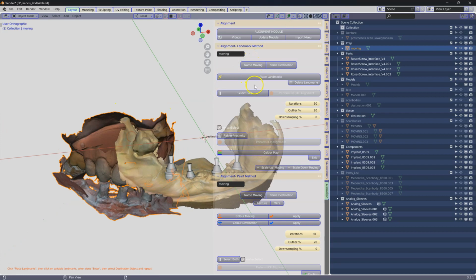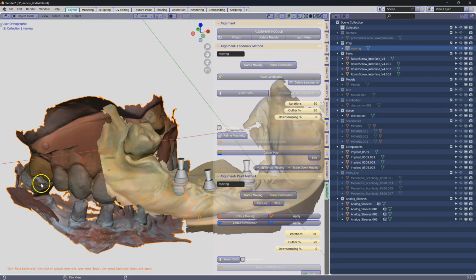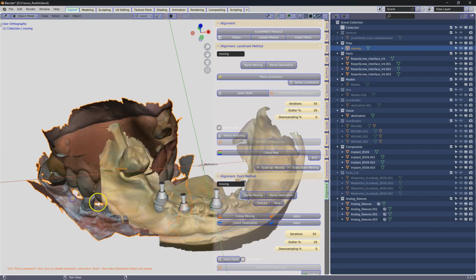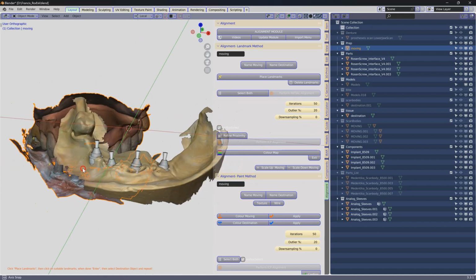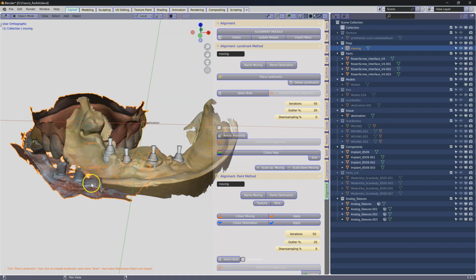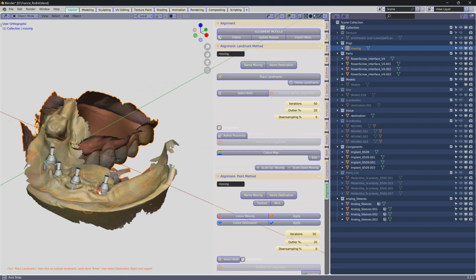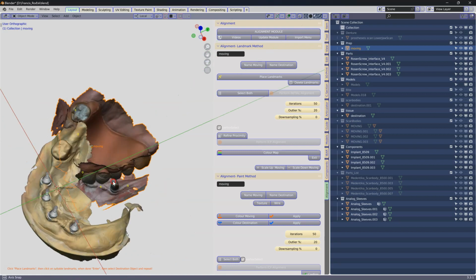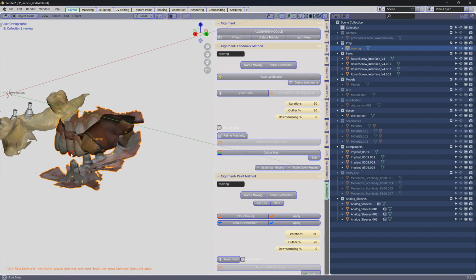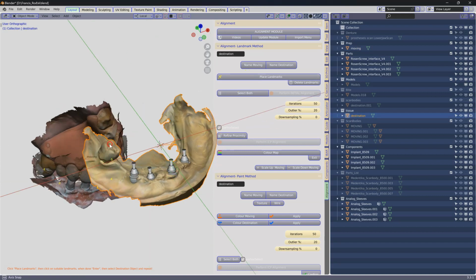We're going to place a few landmarks. So place landmarks. We've got the tooth over here. So on the buccal side here, we're going to move forward. This is all different, as you can see. Perhaps over here there's something similar, and maybe at the end here. We'll try and go with that. Enter. Do the same on the other one.